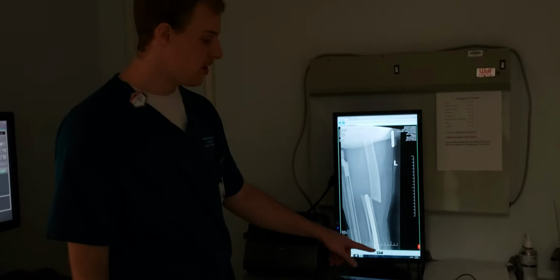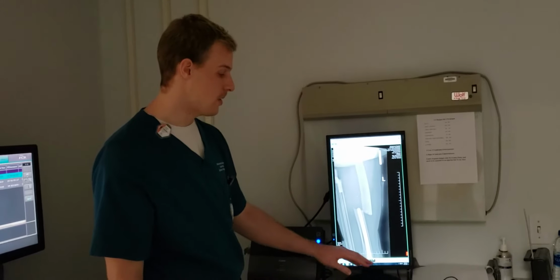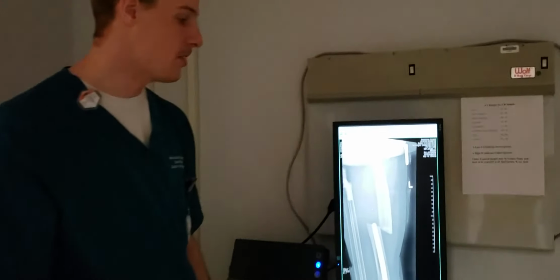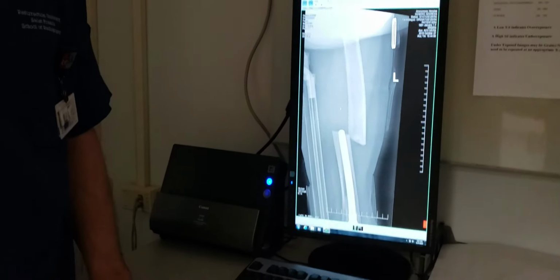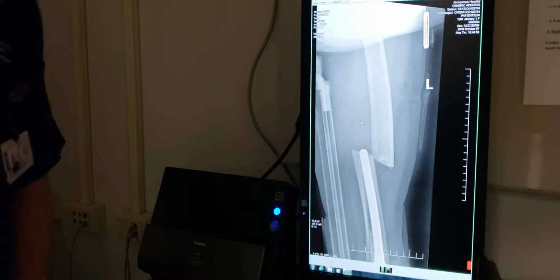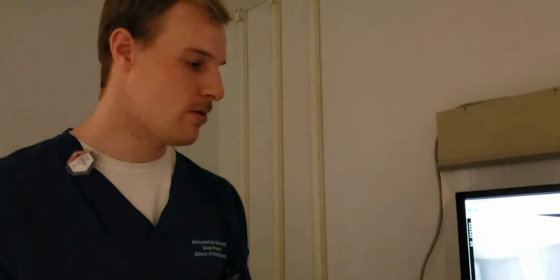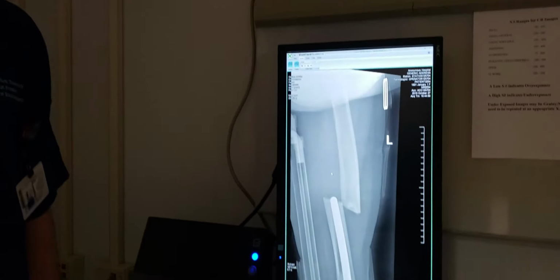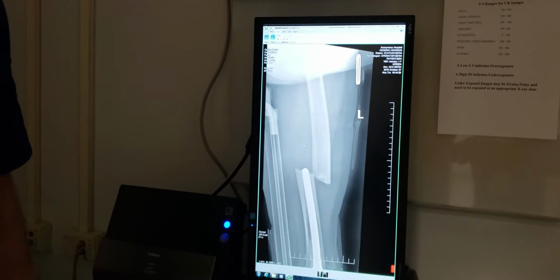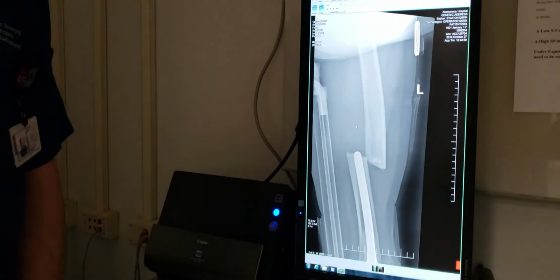distal end of the femur here, but they clipped the entire knee joint here. You can't even see the condyles on the knee, on the femur. But as Lupe said earlier, they did a total knee X-ray, probably 2 views, and that included the joint and a lateral of the knee. So the tech just sort of skipped over the knee and took what they got from this image.